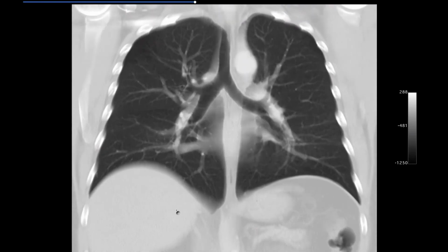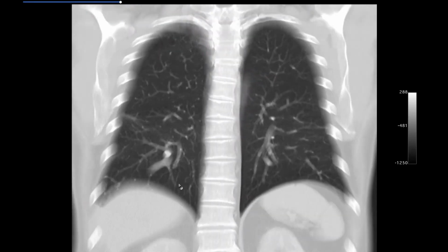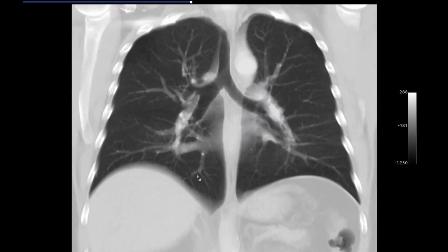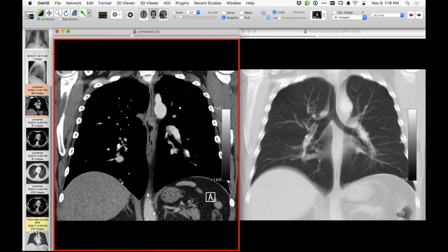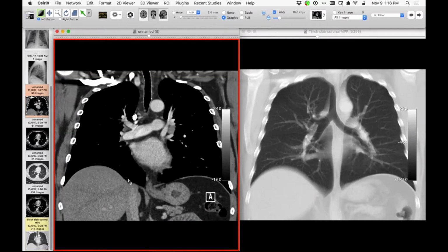It's not arcuate, meaning it's not connecting in two places? Yeah, it's just a bunch of veins, and this one is rather fat, and it just goes into the left atrium there, right? There it goes. There it is. Goes into the left atrium properly.